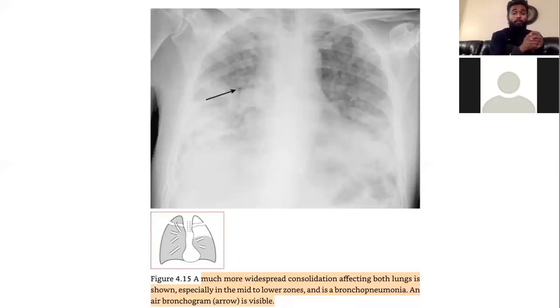Whereas pulmonary edema is where you have fluid, but it's not in the alveolar spaces. It's different, so you don't really get the air bronchogram, which I'll show you. Where is the fluid in pulmonary edema? I never understood that. Yeah, I'm going to show you. It's more in the interalveolar space in the beginning. But if it gets really worse, it can, like in ARDS. I'm going to get into this.